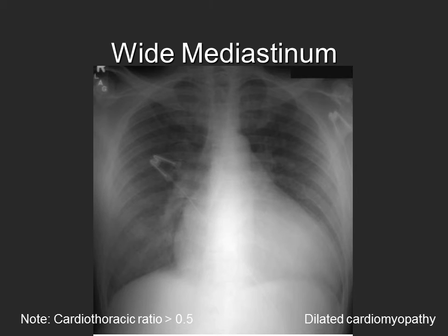This chest X-ray reveals an enlarged cardiovascular shadow. The underlying cause of the enlargement in this case is dilated cardiomyopathy.